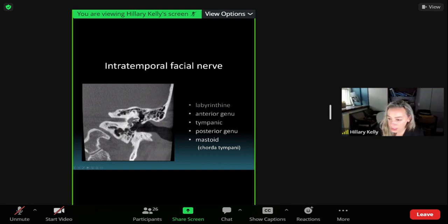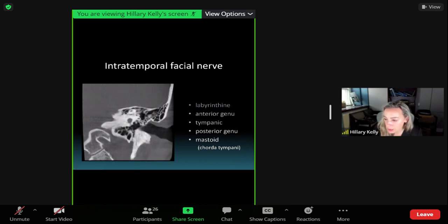This center part of the cochlea is called the modiolus. All right, here's another section just showing that, right? Your nerve coming in through the IAC. This is your big cochlear nerve coming into the center at your modiolus, and the nerves come out along the basilar membrane here. And this is where the sound transduction from sound waves to neuronal signaling happens.